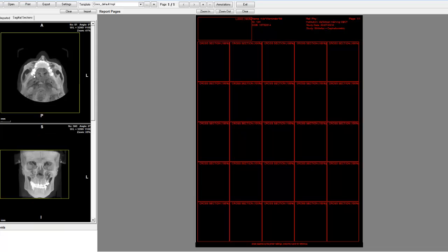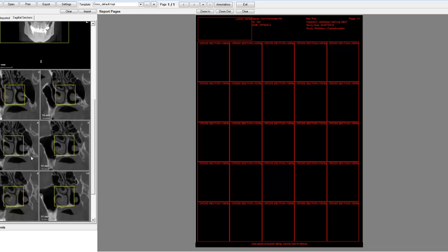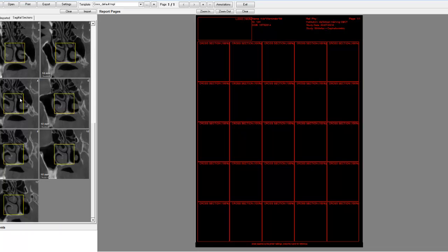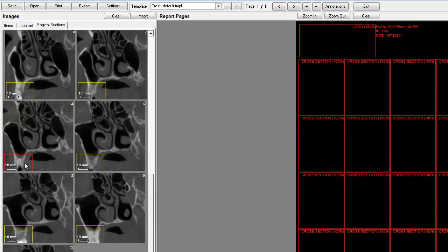And you've got all the cross-sections that we have been looking at and created in the last action. As you can see, you always get the full cross-section, and in order to move it, you simply need to come and navigate through it. We'll see how to do that later.